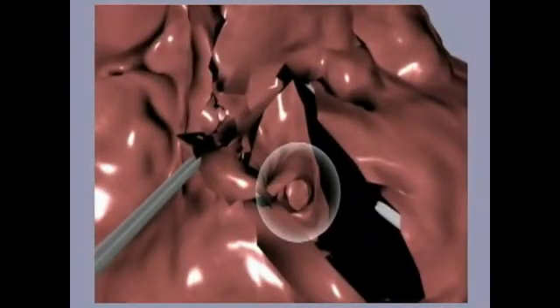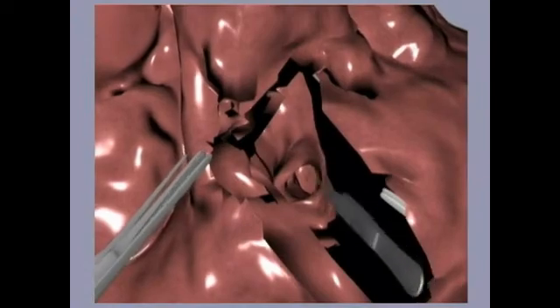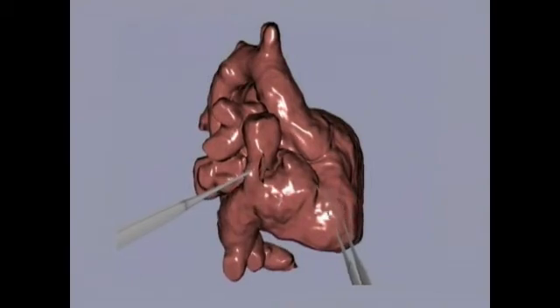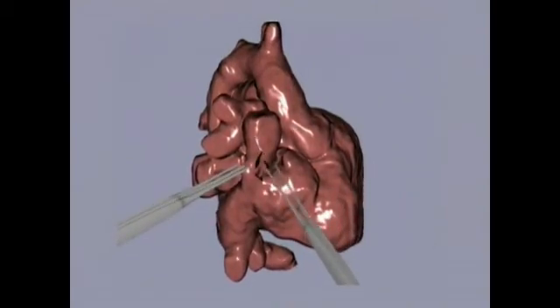The tunnel passageway is quite narrow. The surgeon pulls the tissue aside to see if any of the two defects are revealed. As none of the defects can be located, an incision point at the aortic root is discarded. A different approach would be to enter through the right atrium.